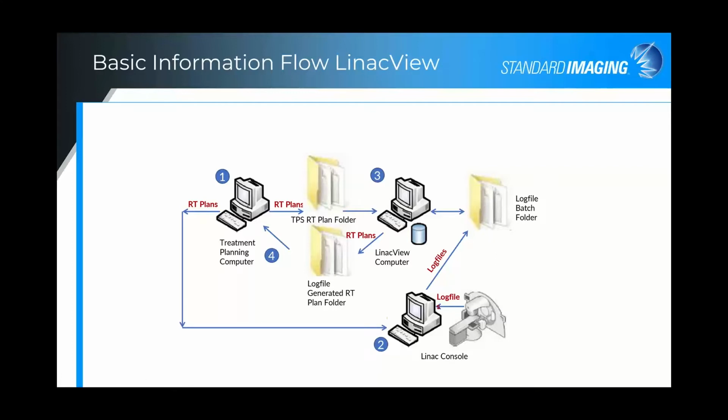You might want to investigate further and re-import that plan as delivered by the Linac back into your treatment planning system, for example, or other external third-party software for 3D dose computation. This is something that one can do just if one wants to investigate further or work it into an automated workflow.